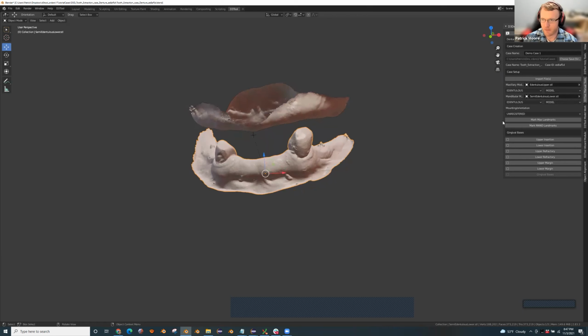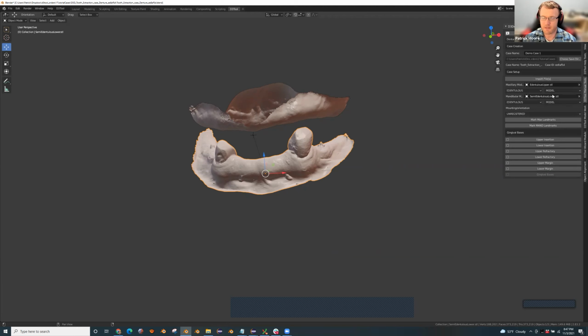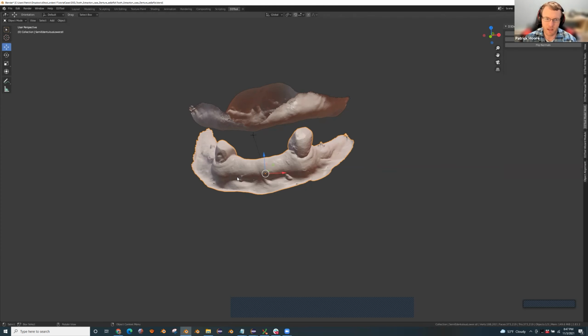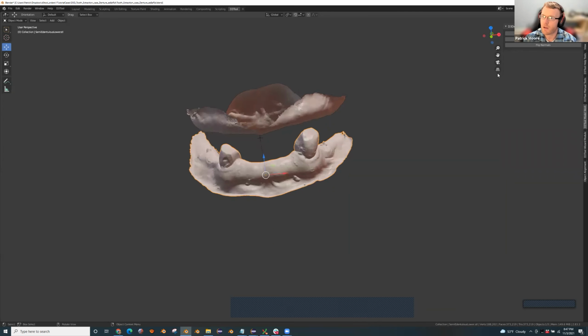So our workflow is keeping track. If you have an active denture case in design and you jump over to the model work and make a change, the case is smart enough to know, okay, I'm working on the lower model for this case. I flipped the normals. It was an impression. Now it's a model.